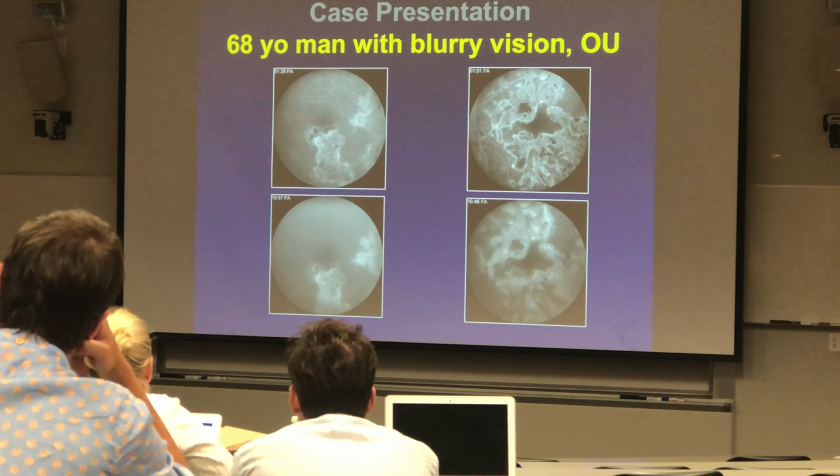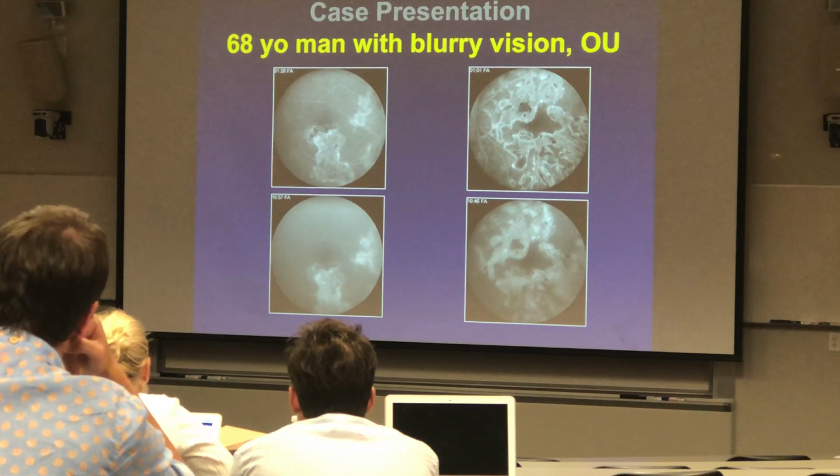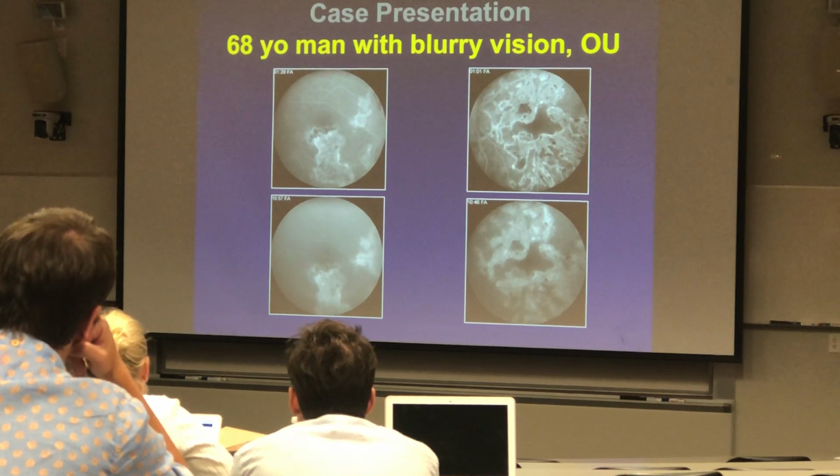So name something that this cannot be among the white dot syndromes. Birdshot? What do you mean? Could it be a case of birdshot? No, unlike MEWDS. So that's something you can rule out right away. It's on the differential diagnosis of white dot, but really it's not birdshot here. So this is something to really consider as something else. That's what we would do in this case.